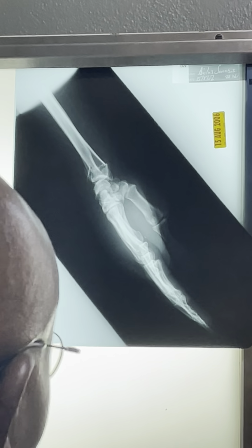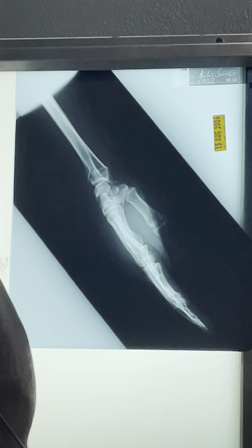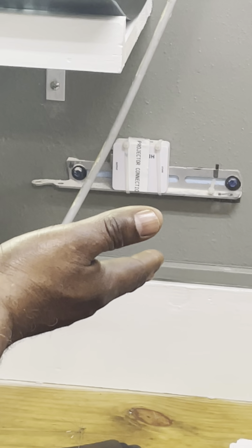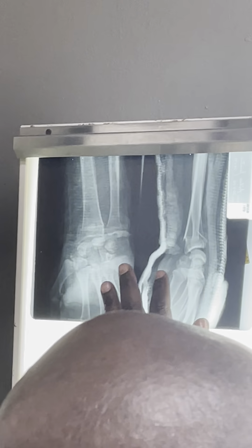Impaction. But also, you just heard me say there's a rotatory component as well, because when you're falling down, what happens? You're falling down, you try to stop yourself. So what happens? You're trying to bring yourself back up. You see how you end up with a rotatory deformity. And there is a 7th thing that I said happens sometimes with the ulnar styloid. Let's see if you can see it here.